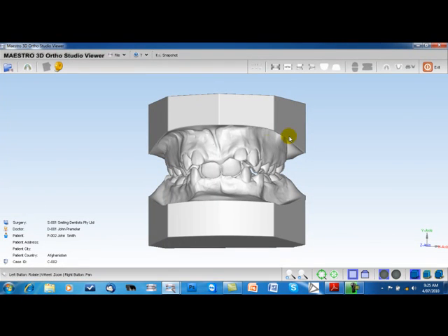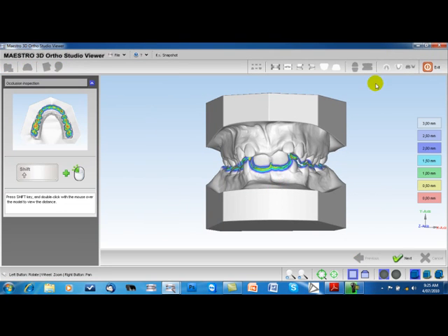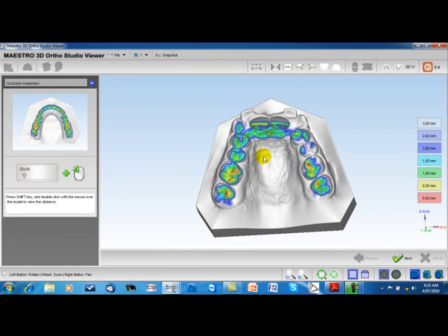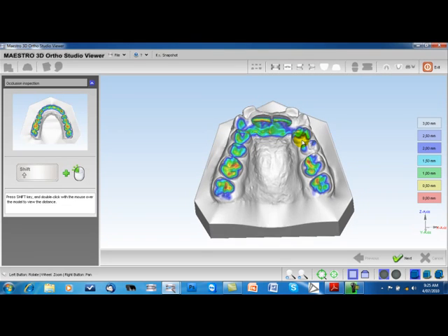And the other three icons on the program are this one here, which we'll click, which is what they call occlusal inspection or occlusogram. If we just click on, say, the upper of that, you can have a look at the contact area of the two models. And this is the legend here that shows you how much. So the red areas is obviously hard contact, and as we go up we have less space between the teeth.